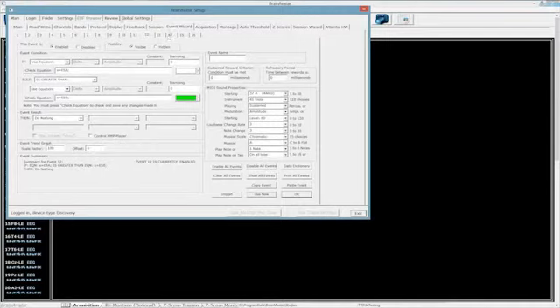Now you may be asking yourself, I'm going off on a tangent. Well, no, I'm not. One of the things that you can have with your events is wanting to use it with third-party programs. There are probably 3 major ones out there. There's, of course, Somatic Vision, which has Inner Tube and Particle Editor. You got CIS, which has 3D Relief and Stone Soup and other programs of that nature. And now, of course, you got brand new Zukor, which has Grind, and I believe they're going to have some new games coming out very soon that are very customizable and very controllable.